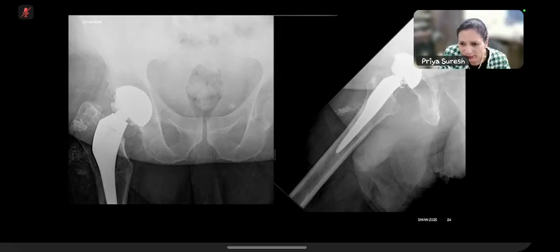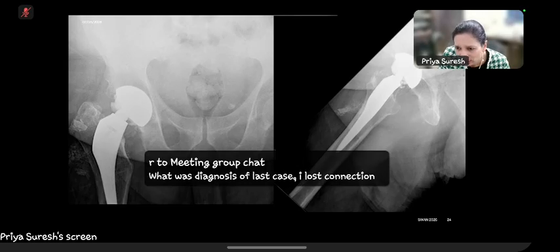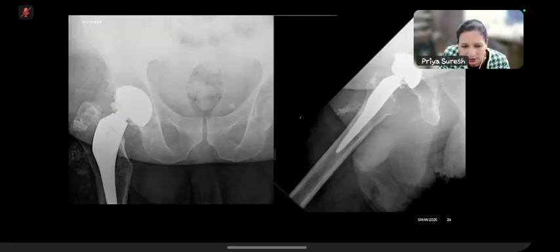So this is the radiograph for the patient at the time of presentation. Okay, so again we are going to look at what kind of prosthesis this is. So it is cementless, so there's no cement at all, and this is that 2 millimeter lucency that I was saying that you should find around. Yeah, so that's what you're seeing. Okay, and then it's a total hip because there's no native hip, and you can see the acetabular component, but you can also see that it's a ceramic head because you can see a little bit of the head itself, whereas if it was completely metal you shouldn't be able to see this part of the stem and then see the head also. Yeah, so you can see the stem and the head.